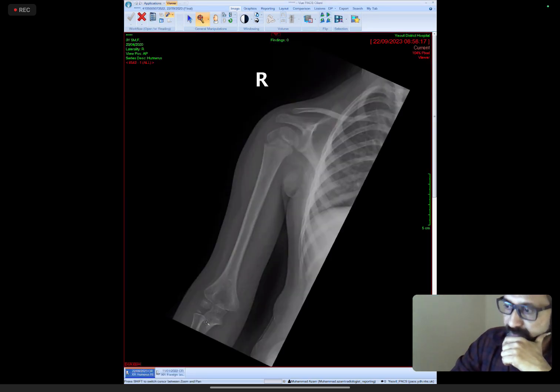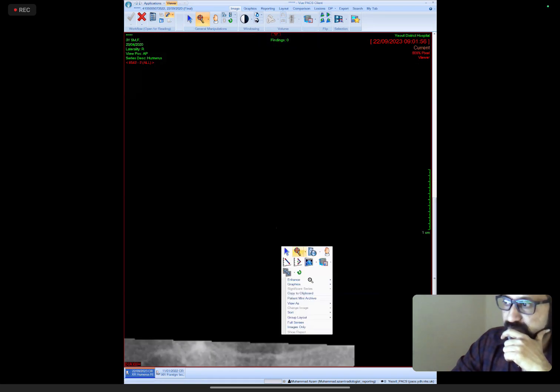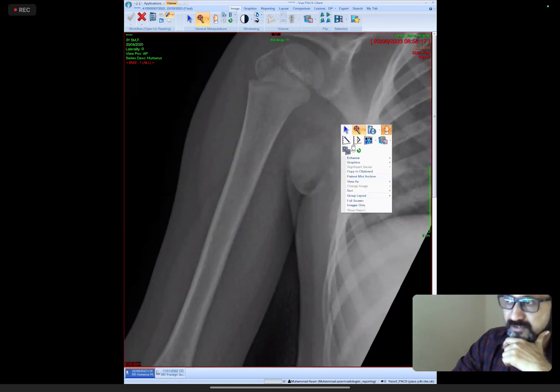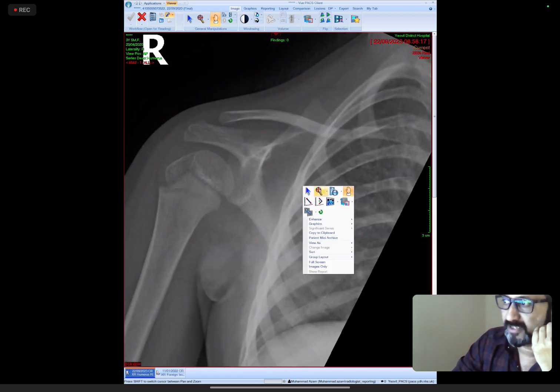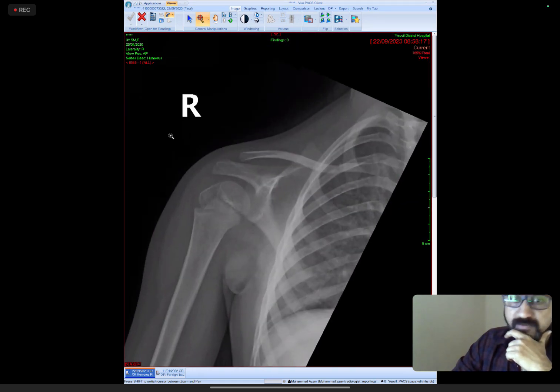Few people have picked it up, and again, this is really an exam case for sure. There is no doubt about that. Absolutely normal, absolutely normal, absolutely normal. Yes, here, there is a fracture. I should have given you this one as well, but I don't think they will give. Some cases are settled, so that's why I'm just planning myself how my exam went. So there is a medial one third right clavicle fracture.